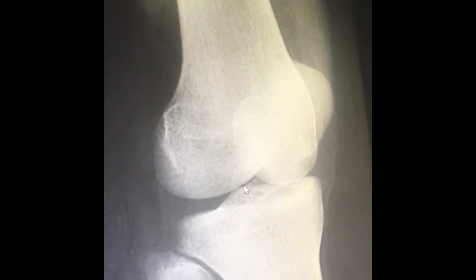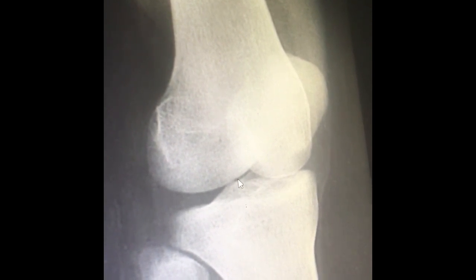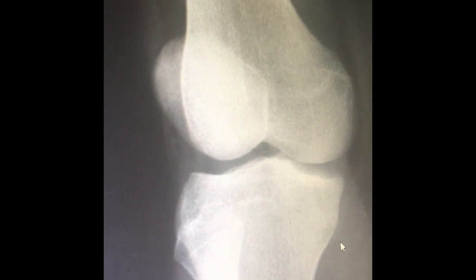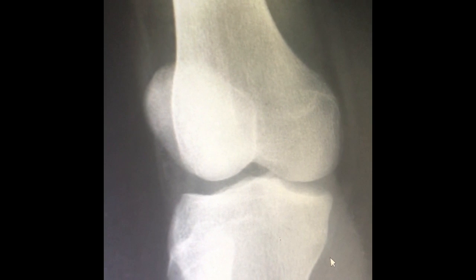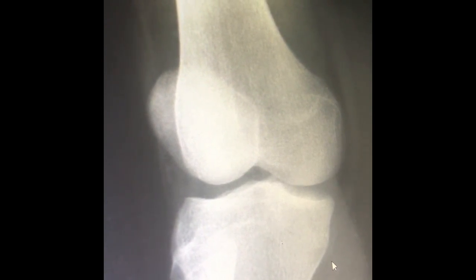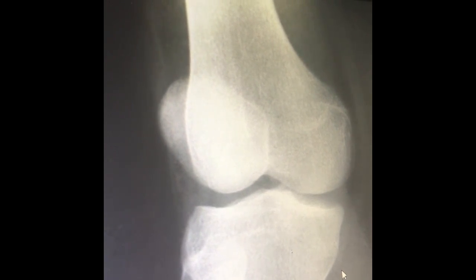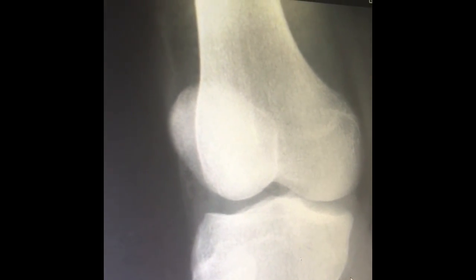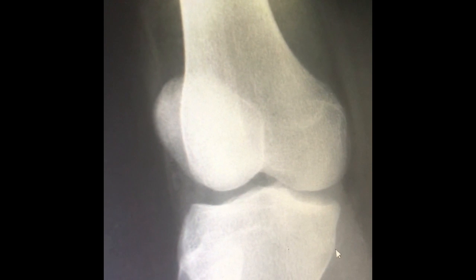And ballpark range for this projection would stay the same as an AP knee, just because we're using table bucky. So 85/5 would be appropriate. And moving on to the AP oblique projection with lateral rotation of the knee. We're just looking out for evidence of proper collimation once again. Medial femoral and tibial condyles. Tibial plateaus are present. Fibula superimposed over lateral half of the tibia, which is the main reason for this projection.